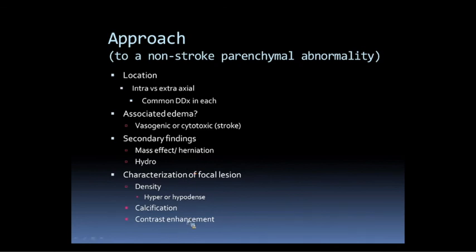And then you can get to things that we talked about, like if there's any focal lesion visible within the edema, can we characterize it with CT? There's usually a lot we can characterize, even with CT, before we get the MR. Okay?